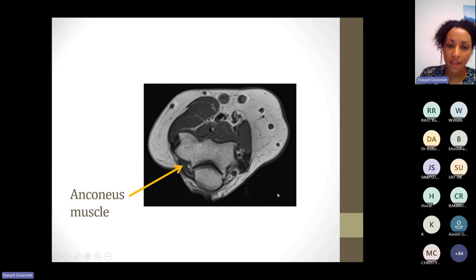And I just wanted to point out here that if you did get a tricky question and you were asked to label this muscle here or this tendon here, just remember the previous image that I showed you, the sagittal of the elbow, where the biceps is quite superficial and it throws off its tendon quite soon relative to brachialis. So actually this tendon here is a biceps brachii tendon when you get to the level of the elbow joint, because we're quite low down now. So that's biceps brachii. Don't be confused and think that that's brachialis. Okay.